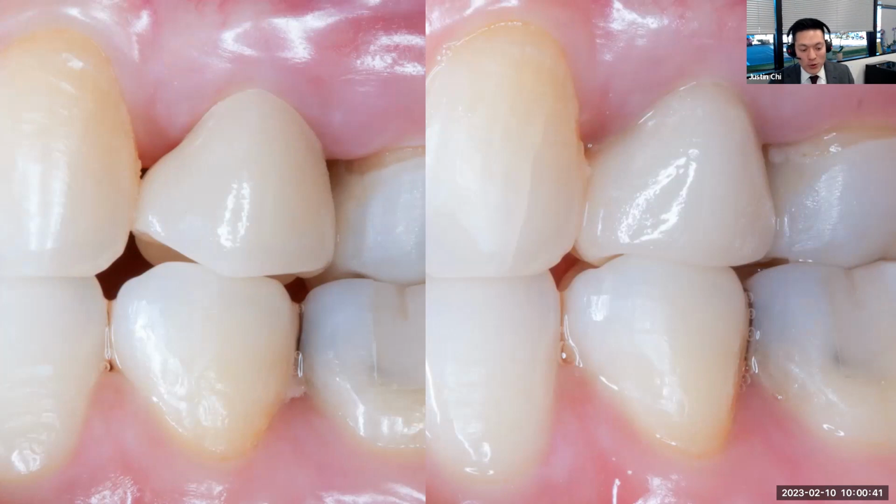It is important before you seat and deliver, bond these restorations in, especially in the aesthetic zone, to let the patient take a look at it and allow us an opportunity to modify it if possible. And this is one of the things, if you are reliant on the lab, you have to send the patient home, provisionalize them, submit for a remake. And while Glidewell is great with a no-fault remake policy, we'll certainly redo that for you. But if you have the control right in your office, you can make the change on the fly at that moment. One of several amazing benefits of having an in-office design.